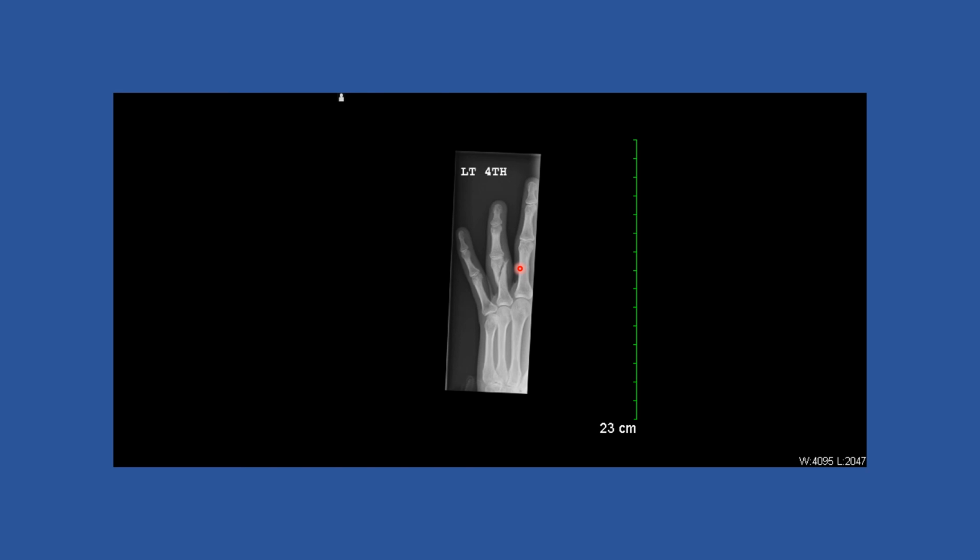It's particularly important with finger fractures to identify whether or not it involves the articular surface. Because if it doesn't, and it's not grossly out of place, then to be honest with you, you can buddy tape them, you can leave them alone. A lot of patients will say, well, it's just a finger fracture, it's just a toe fracture, why do I care?